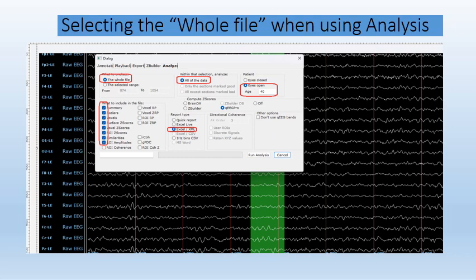And now all of the results, not just the sections that are marked good, because everything is good. And of course, we'll click eyes open and make sure the age is correct. And then the settings on the left will be the ones you usually pick, and the Excel XML is what you usually pick. And then you run the analysis and you're done.